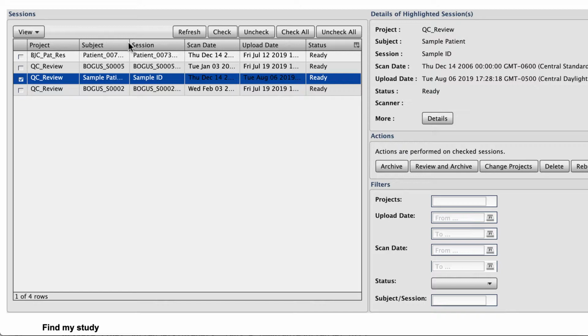And you might be thinking, hey, project members and collaborators can't delete project data. And you would be right. But since this session hasn't been archived yet, it isn't officially considered project data. The thinking here is that being able to clear out a malformed session is a valuable part of the review process, and that this job could and should be delegated to people outside of just project owners.